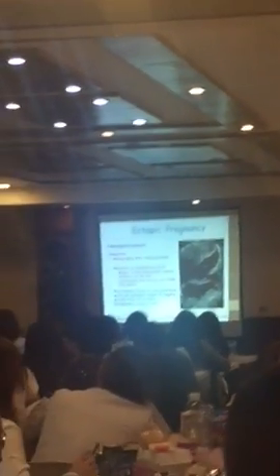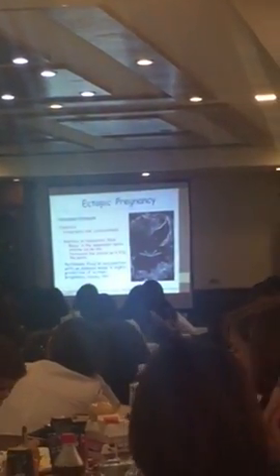The next thing you look for is, where is the uterus? Is the uterus empty? Is there a gestational sac? If there is a gestational sac inside the uterus, in the endometrial cavity, then that is intrauterine. But usually in those cases, they cannot give you an exam with a GS intrauterine without a yolk sac and then a mass outside. Okay, that is one clue that you need to remember. And then another one is the presence of fluid in the cul-de-sac, and that means that it's a ruptured ectopic pregnancy.